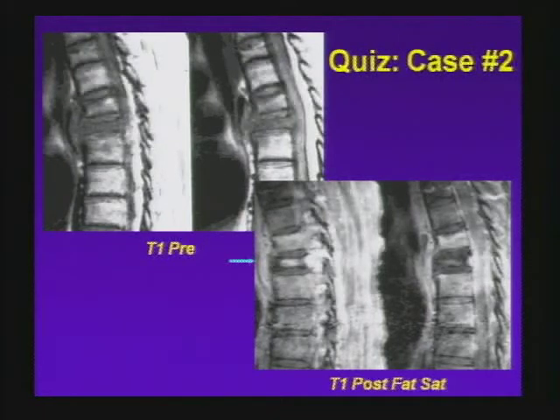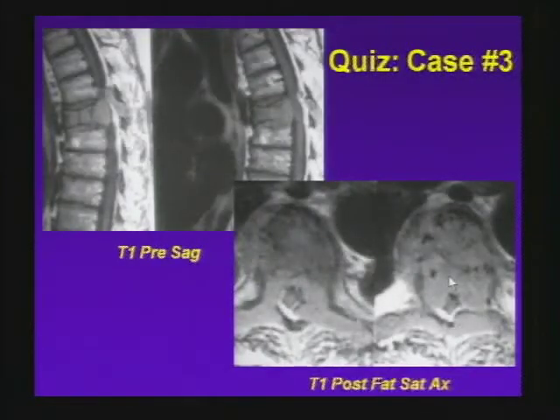And there's nothing more inflammatory than, say, a staph or E. coli infection, and this actually happens to be an osteomyelitis from urosepsis, okay, infection. And the disc is not particularly enhancing, a little bit, but it's really the vertebra. It's more in the osteomyelitis phase than the discitis. Now let's move to patient number 3.